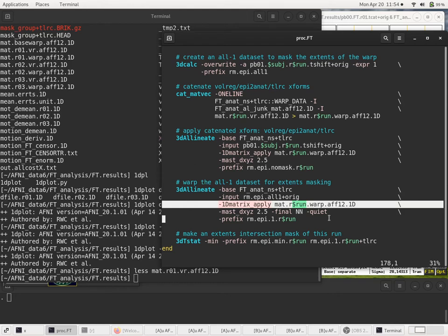So if we have a voxel that, because of head motion, has data at time points 7, 8, 9, 10, 11, 12, 13, 14, but then the subject moved, and due to that motion, that location in space went outside the box, and so the 3dvolreg step created new data there, but since it wasn't recorded, if the subject's head moves outside the box, then there's no data recorded for that same location in the brain.